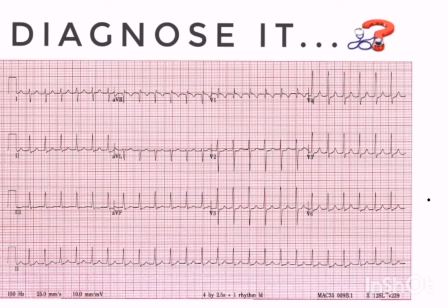By going with the characteristic pattern of seeing an ECG, the thing that we see first is the QRS complex. As you can see, the QRS complex here is less than 3 small boxes, so it is a narrow QRS complex. And if a QRS complex is narrow, then it means the impulse must have originated above the ventricles. So it is supraventricular in origin.